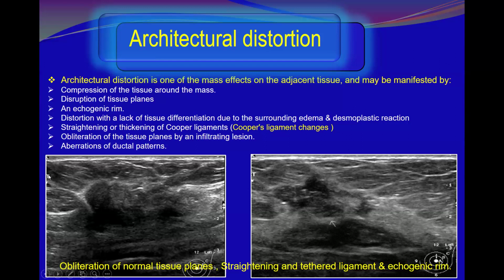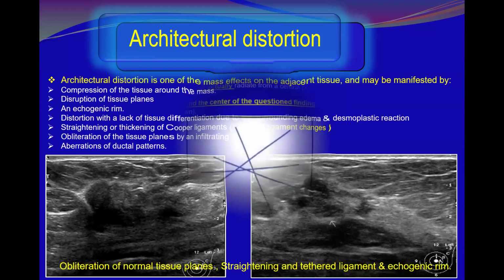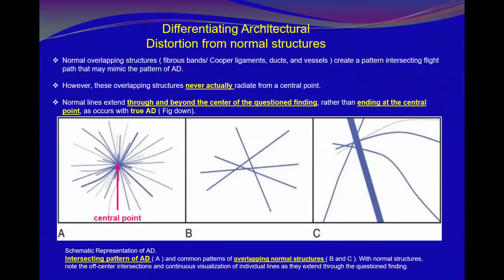If we look at these masses, the two examples here, we can see almost all these descriptors can be applicable in these two cases.